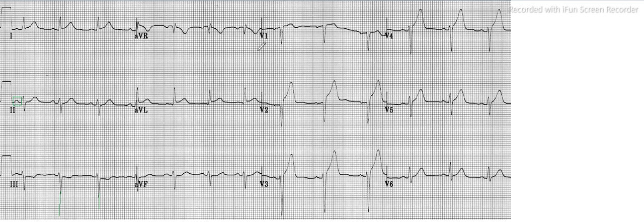Now looking at the axis, if you see here in lead 1, let me draw lead 1 here, this is lead 1, and let me draw AVF. So you see here in lead 1 this is the QRS, and it is positive. So the deflection is positive, so the vector here is positive. So let me draw a positive vector in lead 1.